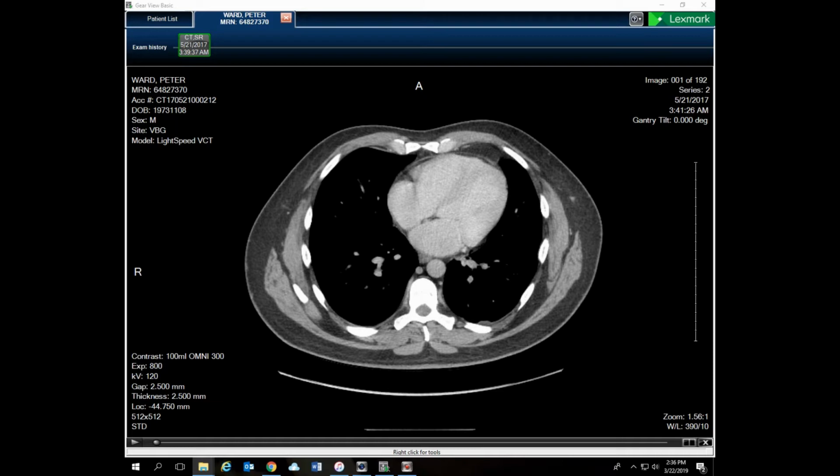So, quick background for anybody who jumped straight to this one. A couple of years ago, 2 years ago really, I had some severe abdominal pain when I was on vacation, went to the hospital and, as is common, got a CT scan to check and see if I had appendicitis or some other weird thing going on. That wasn't the case, but in this third installment I actually have solved the mystery of my abdominal pain, and it was not caught during any of the other workups.